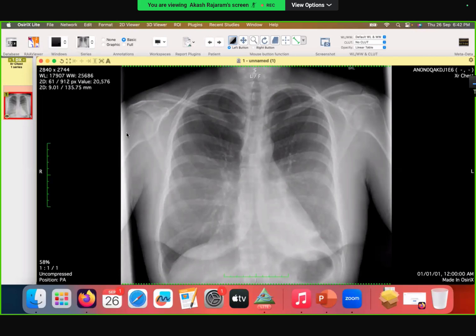and the rest of the left upper lobe appears clear. On the right side, the right heart border seems to be straight, and the ribs appear more horizontal. So I'm suspecting the patient might have a pectus excavatum. In my routine practice, I would check the patient's previous images and check if the patient is still in the department. I would examine him physically, and otherwise maybe check for a lateral radiograph if available.